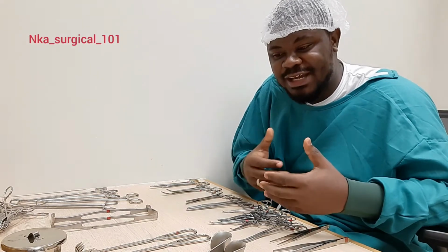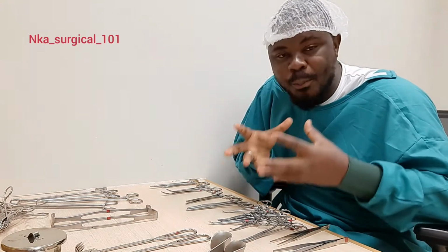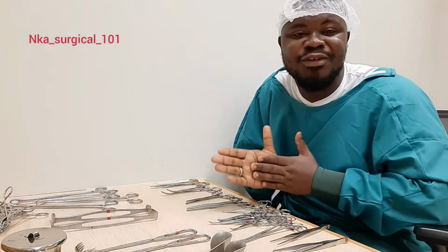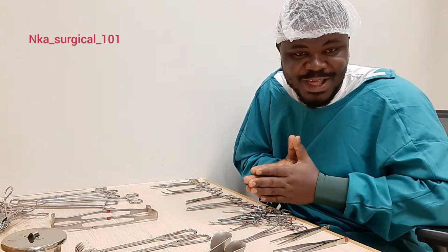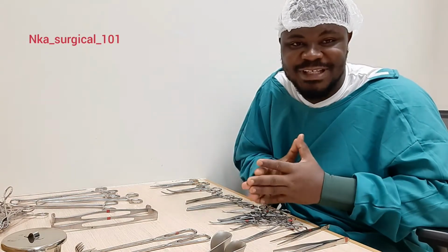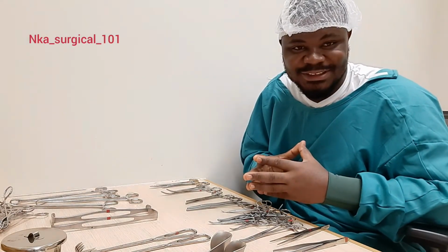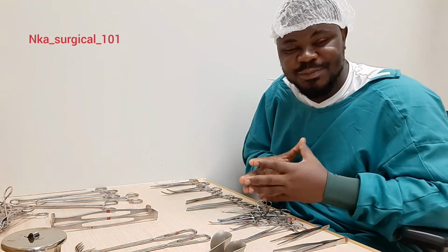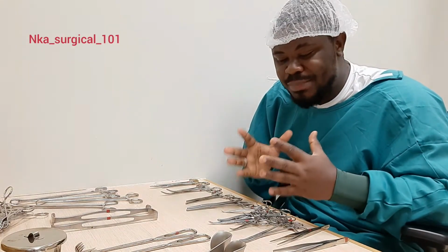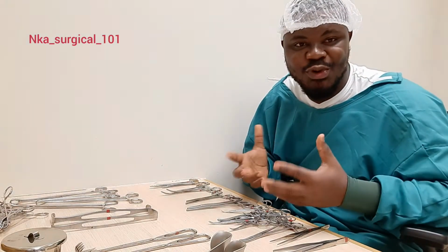And then we also have another category called the special instruments. The special instruments are the special or particular instruments that are special to a particular case, that are added to the general instruments to handle a particular surgery. And those special instruments are the instruments that really differentiate one particular set from the other. So today we are going to be more specific about the general instruments. When we say general instrument, just like I already explained, they are the instruments that we need for every surgery. Every basic surgery or every surgery requires this basic instrument to operate.